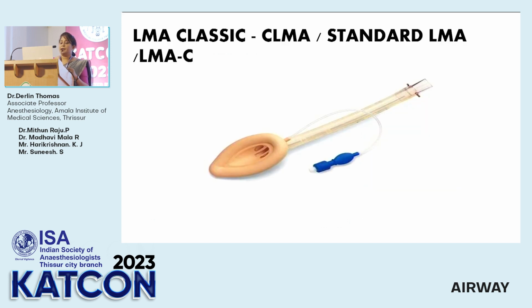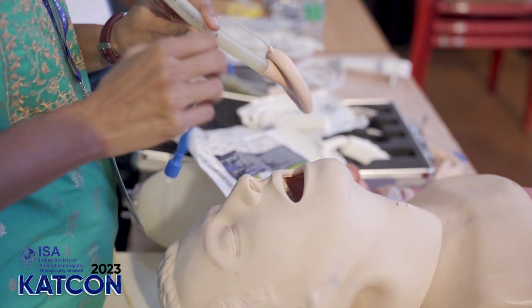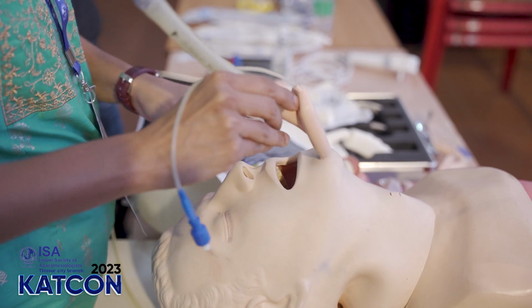Now coming to LMA. This is the classic LMA. You can see the classic LMA is easily identified by the color. This is a silicon material. So the advantage is you can autoclave it. The manufacturer recommendation is 40 times. Most of the data you can see on the tube itself.